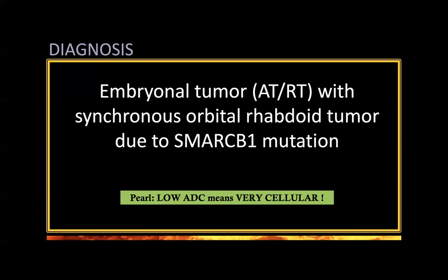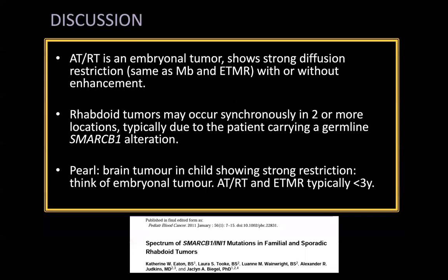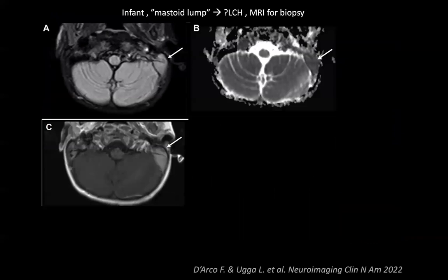So low ADC, trust the ADC first. Low ADC means very cellular. And this is just to show you that, again, a lot of intracranial embryonal tumors do not show enhancement and yet are very aggressive. Then we have this other case.